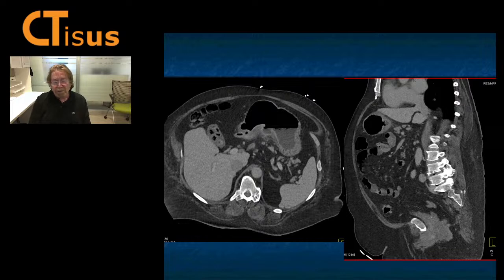Now, benign versus malignant: if the ulcer's big and irregular, if the mass is bigger and bulkier, you would tend to favor malignancy over benign. And whether something perforates or not is not going to help you typically. I don't see any distant adenopathy. I don't see liver mets, obviously, things that would help you go with malignant, but very nicely showing you the lesion. And then let's go a bit further, and I'll show it to you as cinematic.